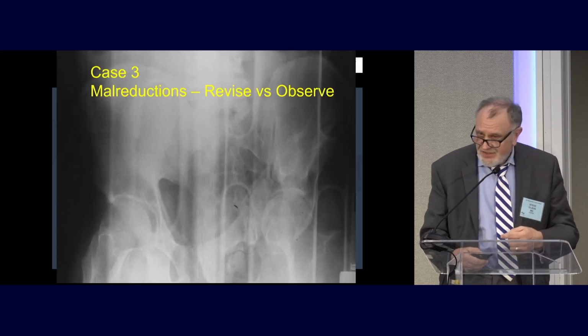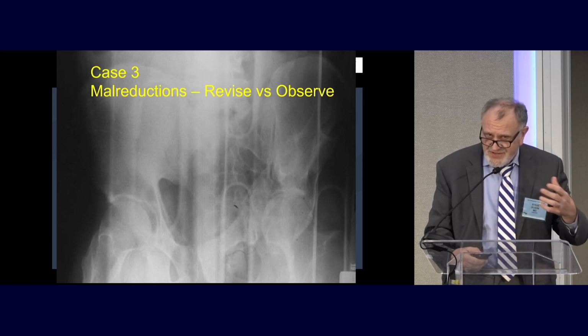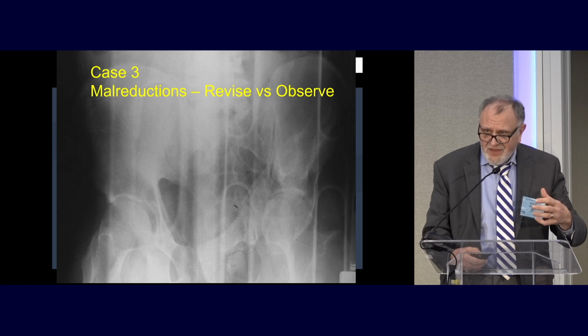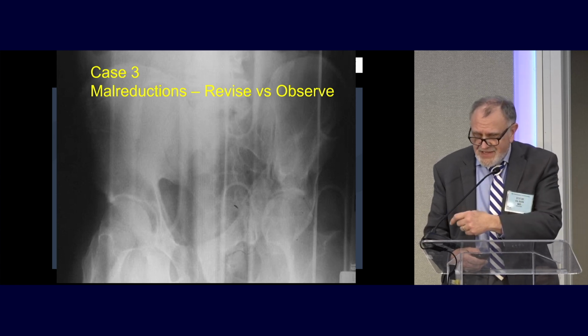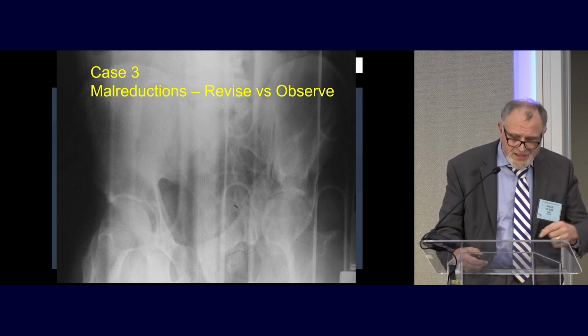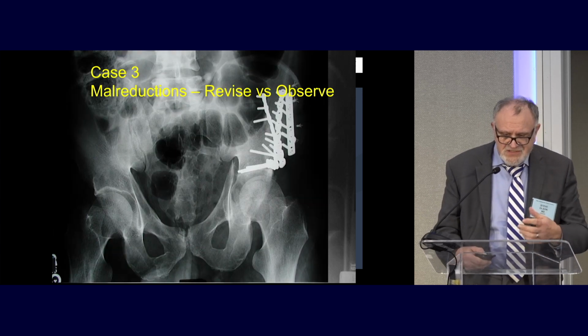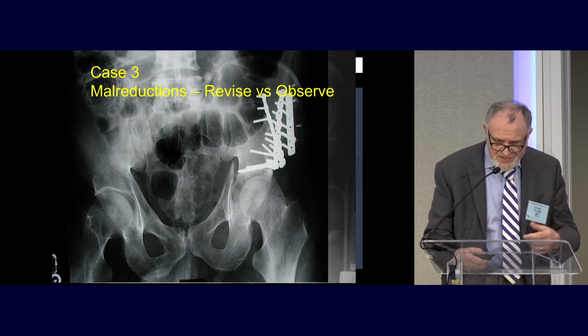So this is a long-term case. Years ago, when I first started my practice in Sacramento, the healthcare organizations owned hospitals. So this is a guy who went to a Kaiser hospital, actually a Sutter hospital, and then came back to UC Davis. This was his only injury film. This is his post-op film. I'm taking care of the guy now. He's like 3 days post-op, and this is what they sent back.